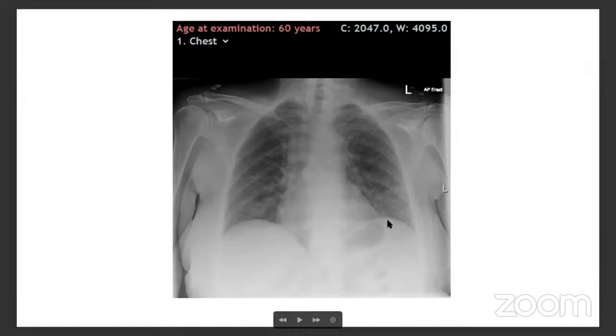Compared to the previous X-ray, you can see there are not much big changes. I can't see any big pneumonia or anything developing. But if you look closely, you can see some additional lines, like interstitial changes. Some are coalescing, so there is something happening. Definitely, the chest could be the source of sepsis because you can see things evolving.